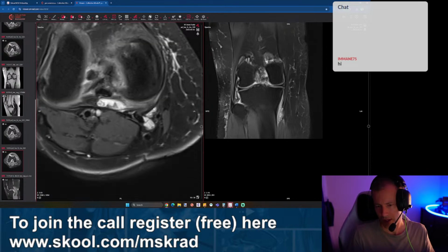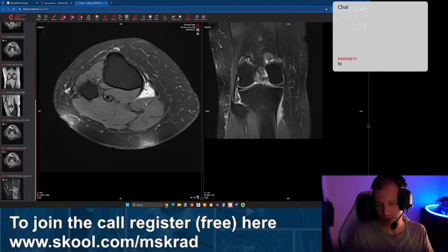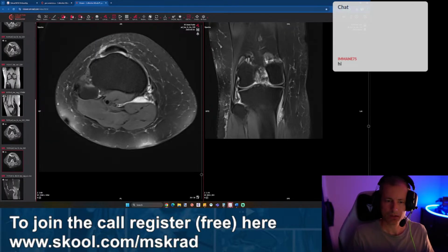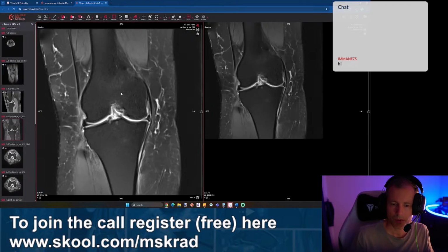But the neck here going down, so I would just go with a ganglion cyst around the semimembranosus tendon insertion here and call it that, and that's it, I think. Yeah, I think that would be the 3 questions.